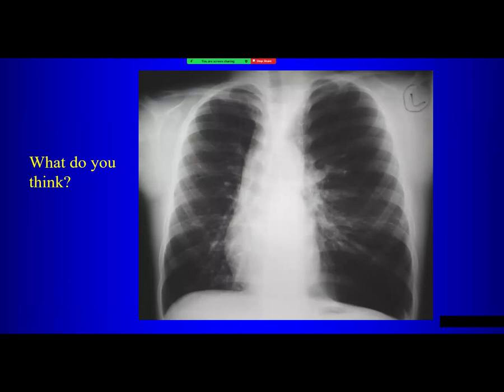What about this case? Any thoughts here? So which lung is abnormal? What side is it? The left?